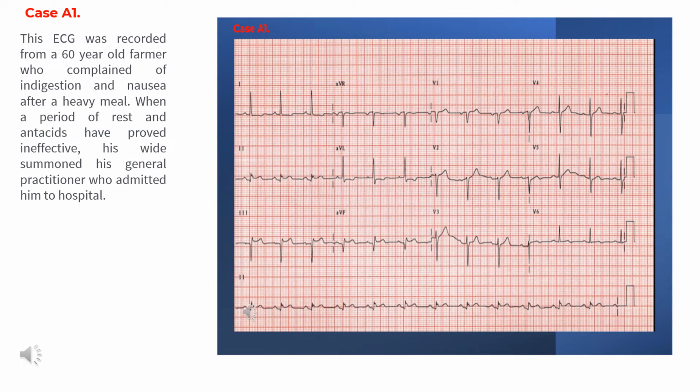Case 1. This ECG was recorded from a 60-year-old male who complained of indigestion and nausea after a heavy meal. When a period of rest and antacids proved ineffective, his wife summoned his general practitioner, who admitted him to hospital.